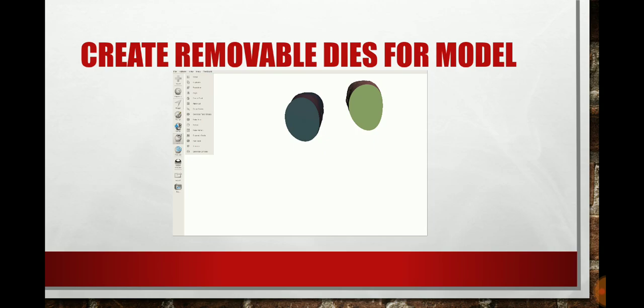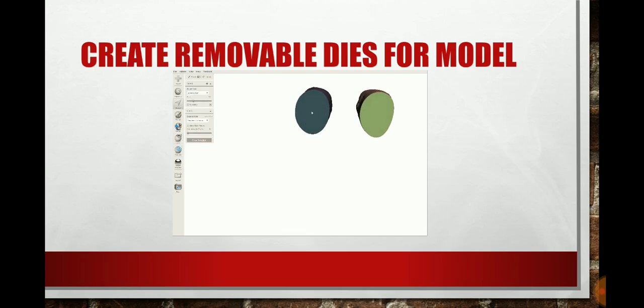Now if you notice on the bottom, we want to hit the select tool. We want to increase the size of our pointer, and you want to hit it right in the middle pretty much. Let that be a little bit smaller, and sometimes I like to have them a little bit bigger because it's a little bit better if you have it a little bit larger.